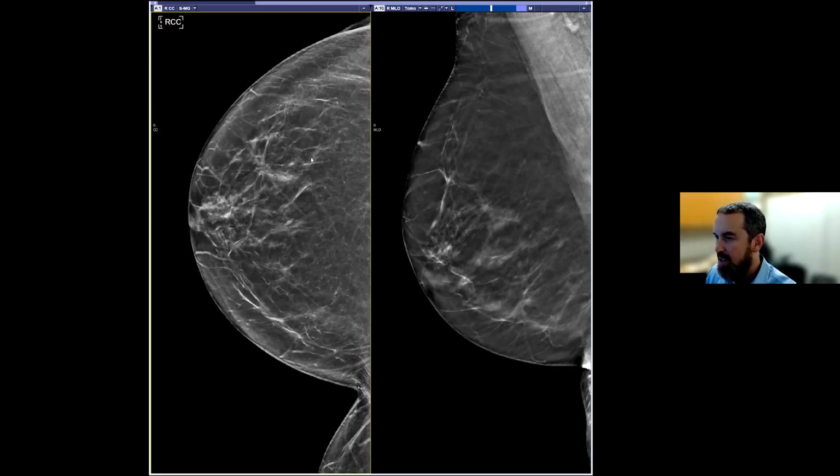So the reason this happens is that some of those reconstruction algorithms developed by the companies that make mammogram machines have, as part of the algorithm, they try to make overlapping structures look like distortion in hopes that it be more readily identified as true distortions. But occasionally you do get the appearance where it's a pseudo distortion, not real, don't need to call the patient back for any further evaluation.